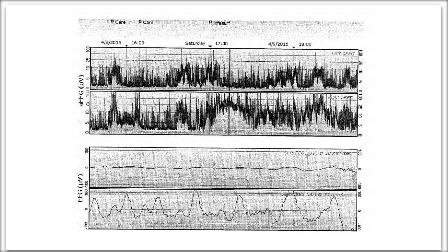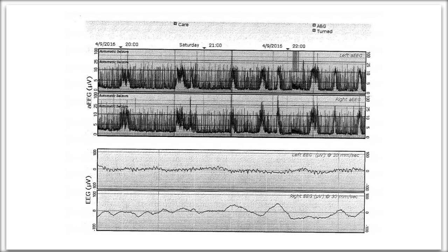All right, I'm sorry. So again, just looking at the EEG, it has some spikes, but I don't think they look like the classic spike wave. Certainly rhythmic, but difficult to know what exactly was happening in that moment. And I see again the breakthrough of some high frequency as well. This one is a better example of the high frequency breakthrough on the left EEG. And there are areas that are definitely recurring multiple times per hour, where you see the upper and lower margin shifting, definitely against a very bad background pattern.